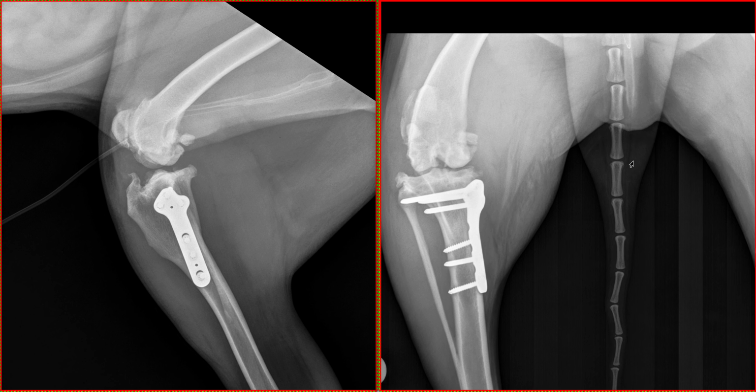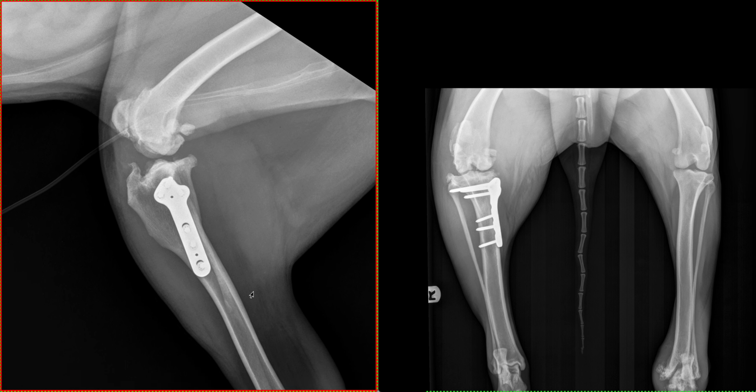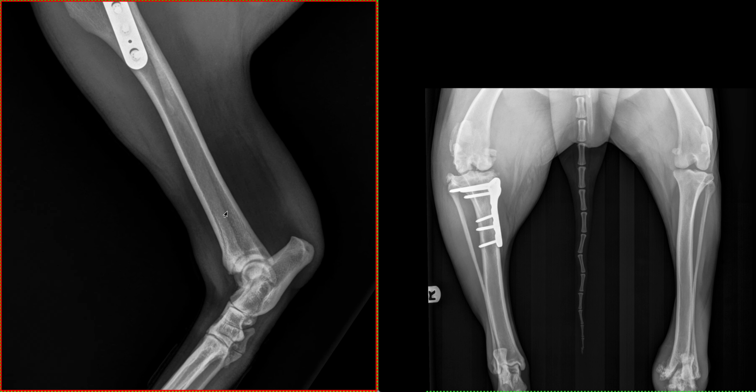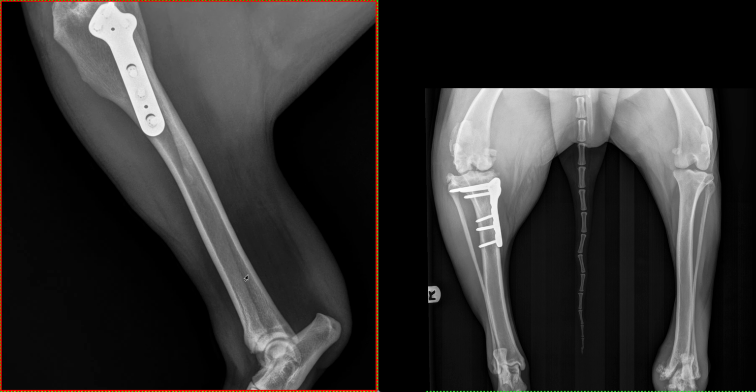If we take a slight step back, we do observe that there is an increased muscle mass relative to the left. However, the positioning is not symmetrical, nor do we have complete inclusion of the thigh muscles. So this is subjective at this point. The popliteal lymph node is incompletely defined, but subjectively enlarged. On closer inspection of the tarsus, there is very mild remodeling of the craniodistal margin of the tibia.